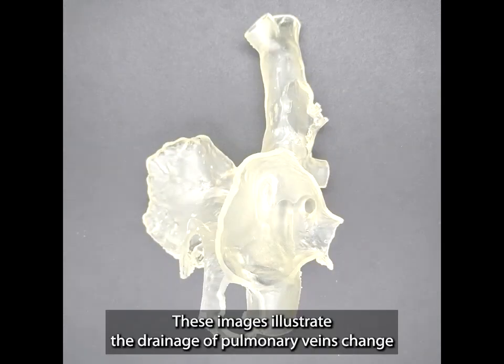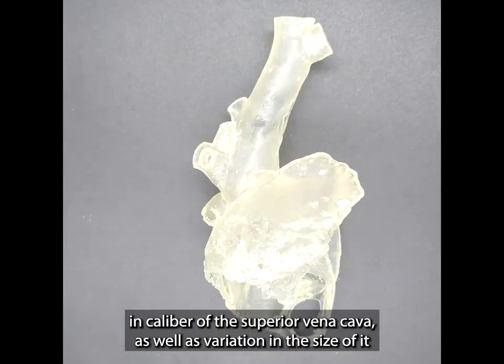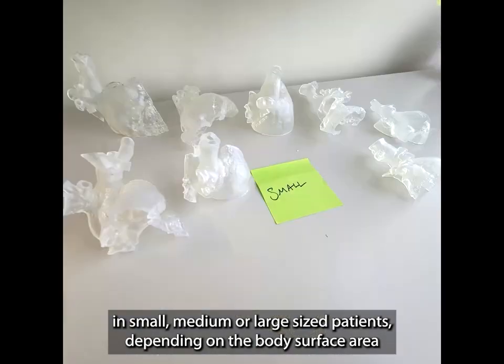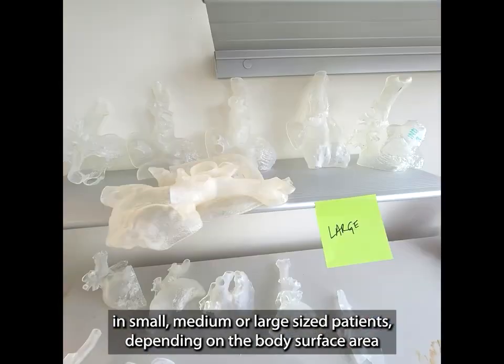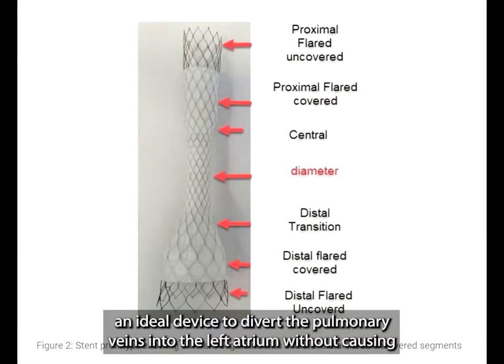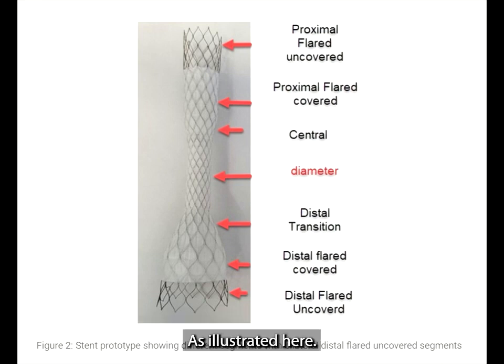These images illustrate the drainage of pulmonary veins, change in calibre of the superior vena cava, as well as variation in the size of it in small, medium, or large-size patients, depending on the body surface area. To accommodate the variation in the size of the superior vena cava, an ideal device to divert the pulmonary veins into the left atrium without causing obstruction to the systemic venous return requires a stent with graded dimensions, as illustrated here.